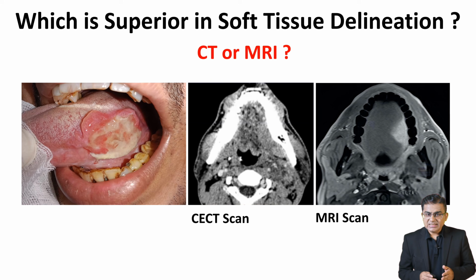Because of this clarity, you can even measure the depth of invasion down to the millimeter. You can clearly identify the midline septum in coronal section and see exactly how close the tumor is. You can confidently assess the genioglossus, the hyoglossus, and other deep muscles. You can even reliably assess the neurovascular bundles.